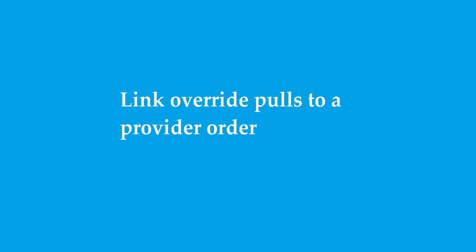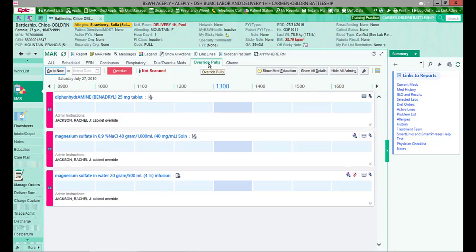In this lesson, we will take medications that we've pulled on override from the cabinet and link them to a provider order. As you can see, I'm in my patient's chart and I've opened up the MAR screen and drilled down to my override pulls only. There are 3 medications that have been pulled from the cabinet without an order, all marked by this magenta bar here. Some magnesium sulfate and some Benadryl.